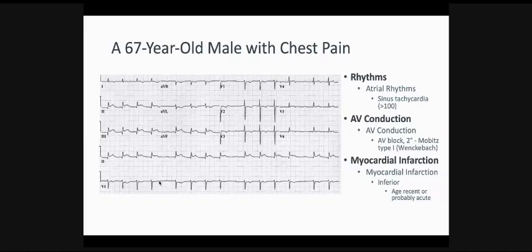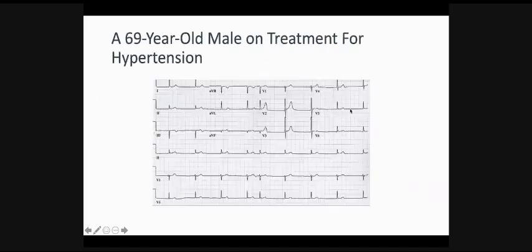And we know that at this level, you all should know how to diagnose an inferior myocardial infarction, but the trick in the exam is, will you be able to diagnose the AV conduction block associated with the inferior myocardial infarction, or the other complications like the posterior myocardial infarction extension or right ventricular extension.